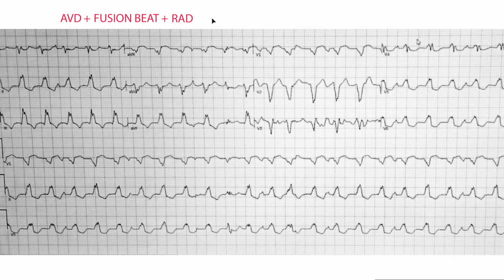Okay. Now, if I'm suspecting ventricular tachycardia, look at our fusion beat. So it comes on time. It comes on when you would expect it, maybe a little bit early. It doesn't matter, but it just looks like a hodgepodge of something going on. And that's exactly that atrial signal in combination with the ventricular signal, or ventricular depolarization. Now, so far this would be enough to call it ventricular tachycardia, but let's see if we can get anything else out of this ECG.